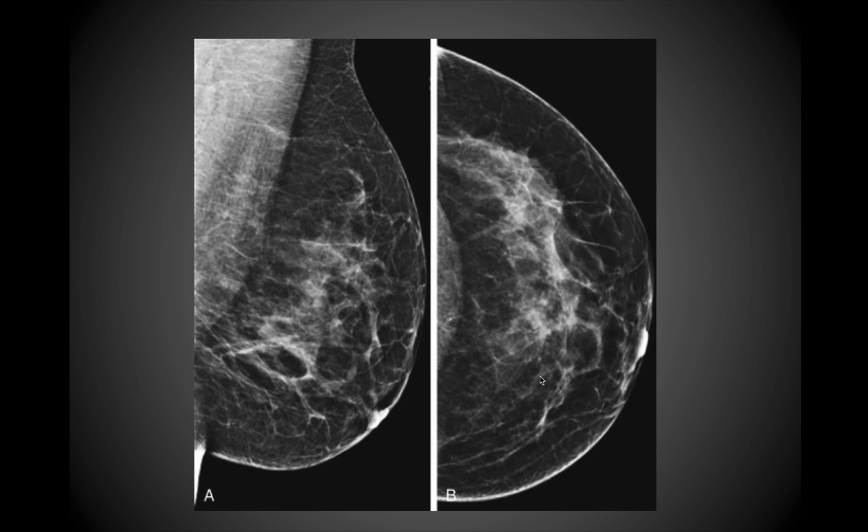So just a quick note on mammography. Obviously this is something that's widely done, so I wanted to make sure that we at least cover it briefly. So this is two separate views of the breast on mammography. Realize that a mammogram is an x-ray where the breast is positioned in between a detector plate and an x-ray beam, and the x-ray then moves through the breast tissue.